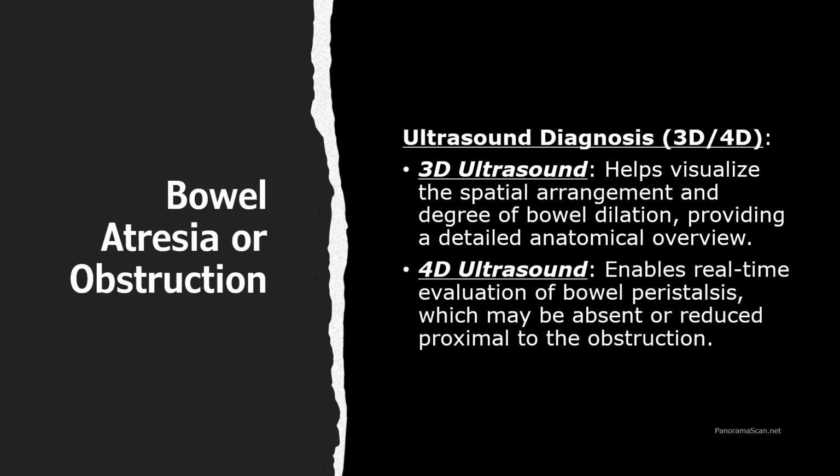4D ultrasound enables real-time assessment of bowel peristalsis. In cases of obstruction, peristalsis may be reduced or absent in the affected segment, helping to confirm the diagnosis. Together, these advanced imaging techniques enhance diagnostic accuracy and aid in prenatal counseling and postnatal planning.